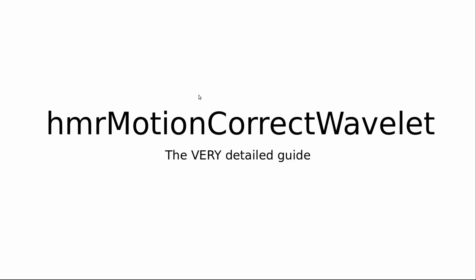Everybody, this is going to be a long time coming. This has taken me a few months. This is the hmrMotionCorrectWavelet, and I'm going to go quite in detail here, with the end slide just giving the summary and probably the most useful aspect of it.